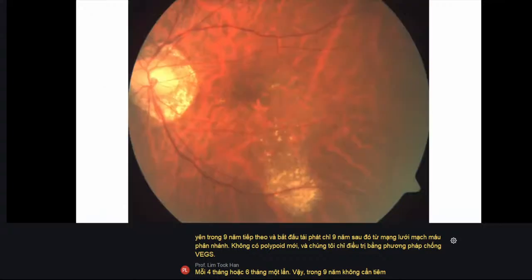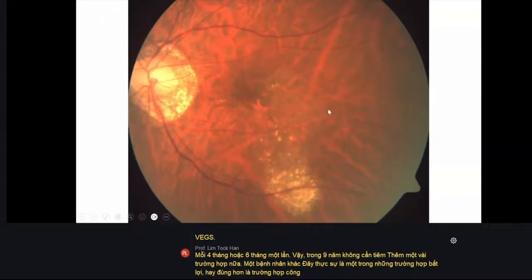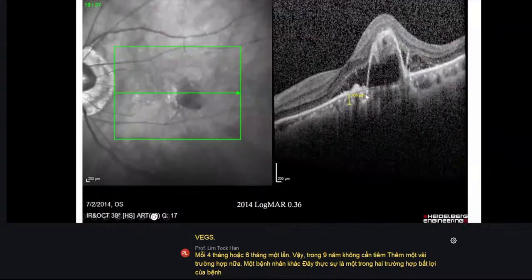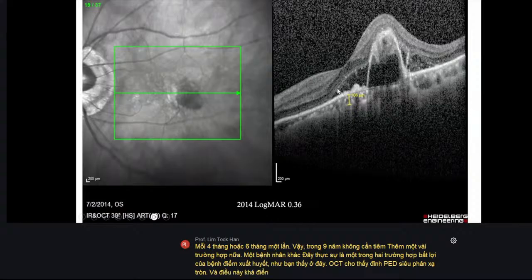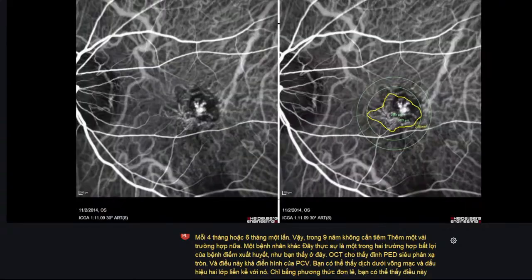Some more cases. Another patient, this is actually one of the Everest case, or rather Everest 2 case, exudative maculopathy, as you can see here. OCT showed peak PED, round hyperreflectivity. This is fairly typical of PCV, yeah? And you can see subretinal fluid and its double layer sign adjacent to it. So just by monomodal, you can say this is likely to be polypoidal.